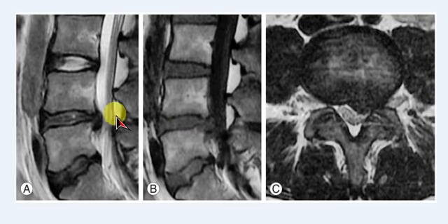We need to understand that these two images are different weights. So this is T2 and this is T1. In T2, remember, the 2 means that two structures will be bright or white. So fat and water both will be bright on T2, and only fat will be bright in T1, because you can see this epidural fat is white or bright over here, and this is T1. The CSF is black, as well as the intervertebral discs. They don't show any fluid, and there's no brightness, so that means this is the T1 weighted image and this is the T2 weighted image. And similarly we need to go to the cross section to find out the pathology.